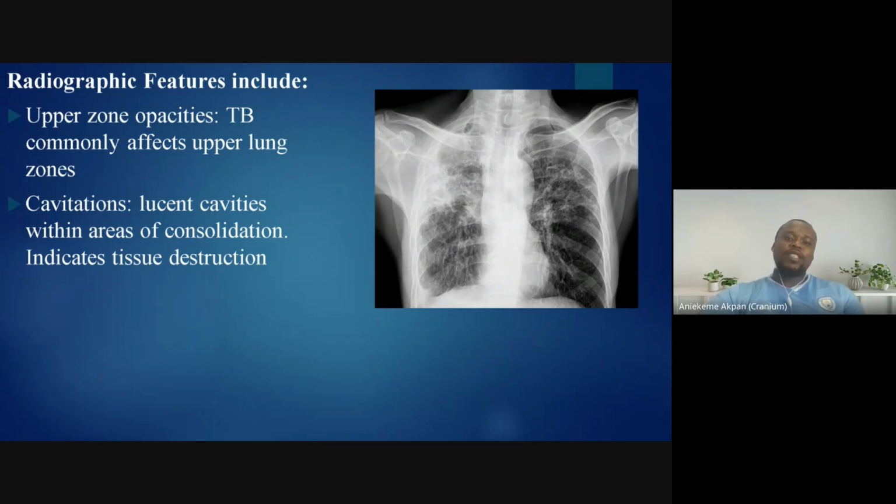That's why we always say that cavitations are mostly associated with tuberculosis. And when we started, we said the patient might have weight loss, might have dyspnea, will have productive cough, might have difficulty in breathing, and so on and so forth. And this is pulmonary tuberculosis.